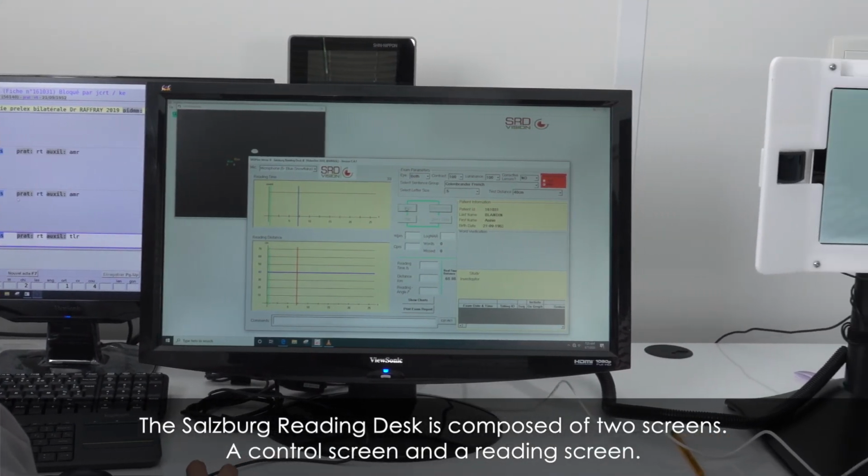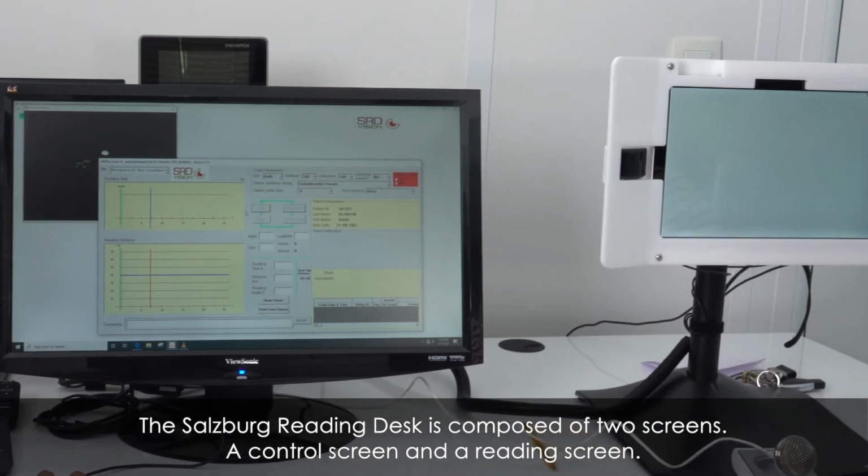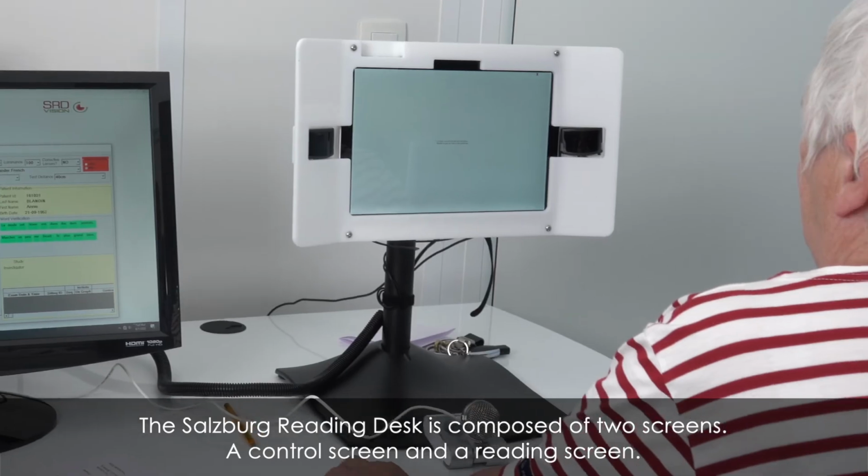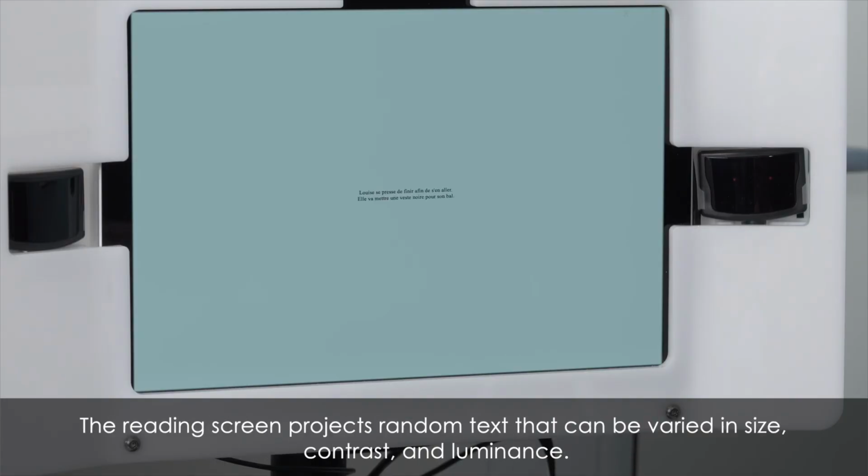The Salzburg Reading Desk is composed of 2 screens, a control screen and a reading screen. The reading screen projects random text that can be varied in size, contrast and luminance.